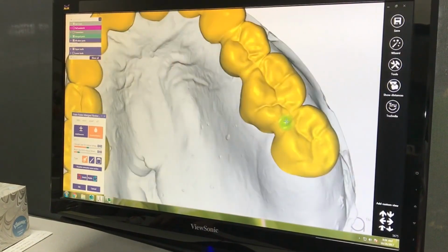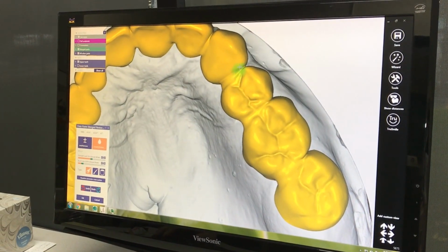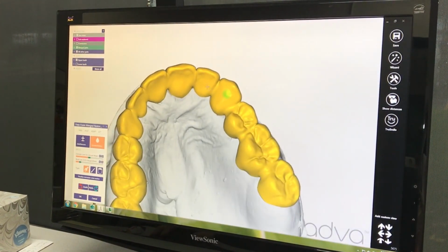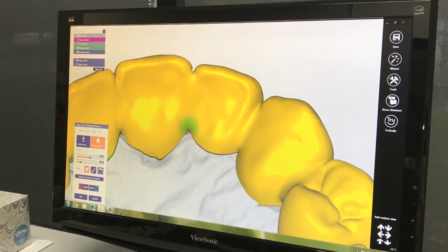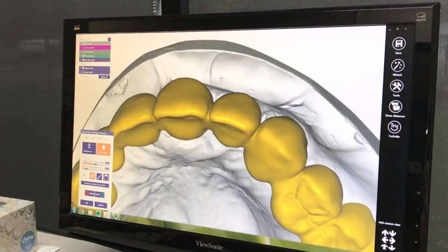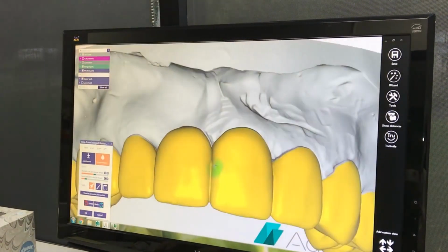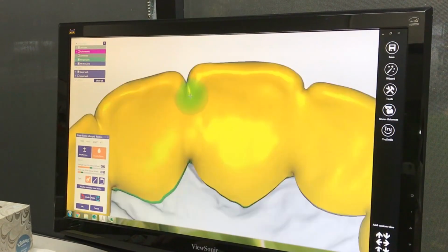Okay, hi. So we're back on the design, just showing polishing up everything that Nora has designed. So we have the wax up. We've adapted the teeth, and the design has been facilitated by Luke, and the video is also on Facebook. You can look it up there. Right now we adapted the teeth and we have done the connectors, and they are ready to go.